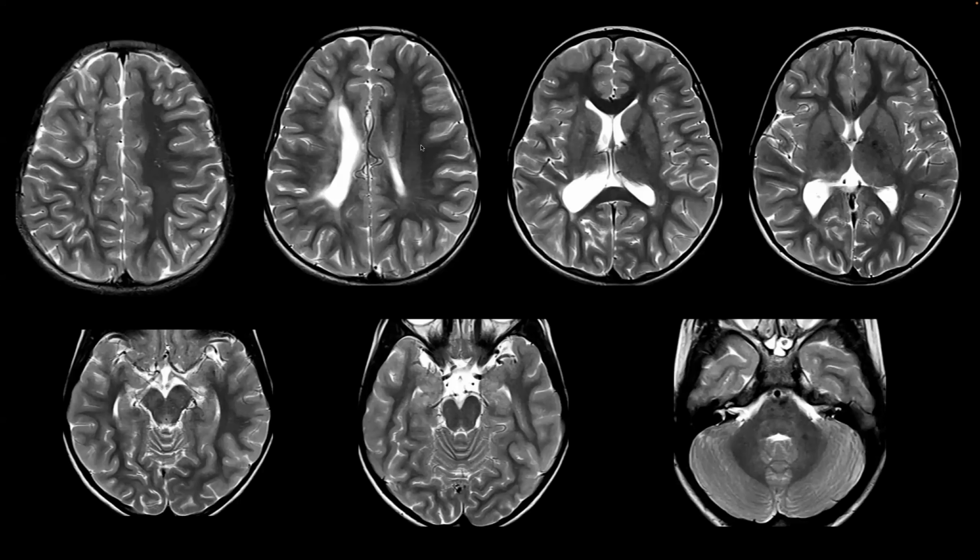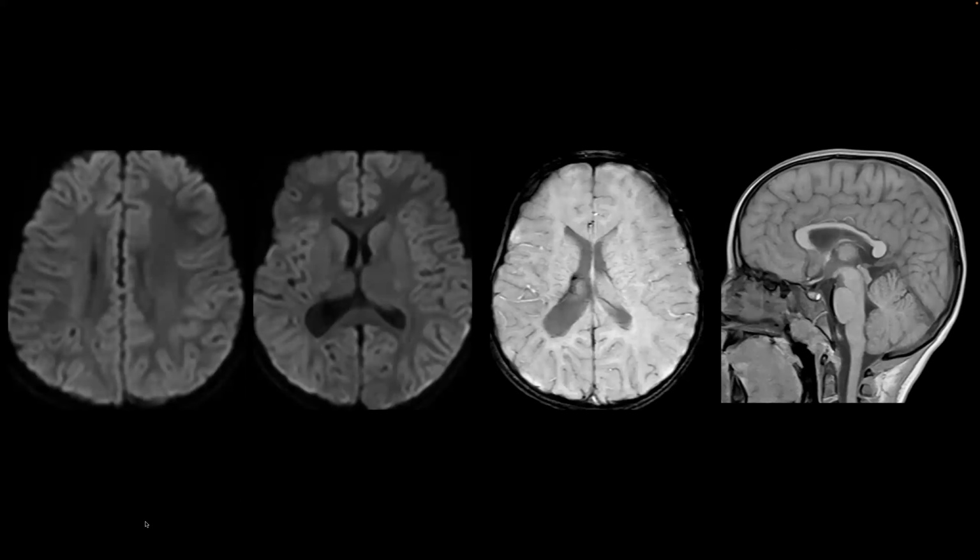There is generalized cortical volume reduction, possibly slightly more on the right side, as you see on the second image, and Wallerian degeneration across the lateral corticospinal tract. In the cerebellum, I could not appreciate any other findings or structural malformations. On diffusion, there was no acute abnormality. On the SWI or GRE sequence, I could appreciate a focal area of possible hemosiderin deposition along the right lateral ventricle, which you can see on the third image. On the sagittal images, there was some thinning of the corpus callosum, especially in the body.